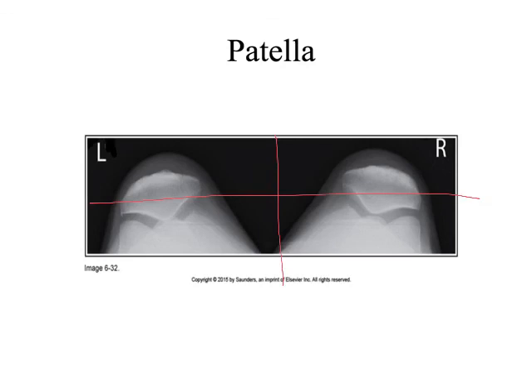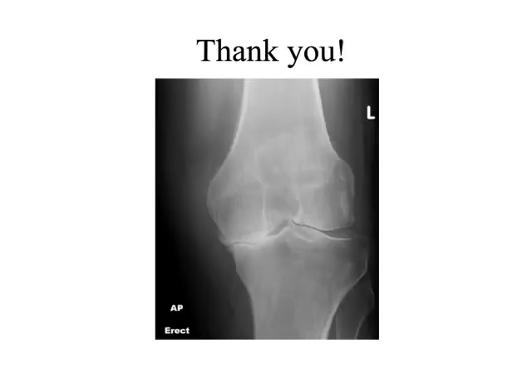Yeah, it looks like this image is not appropriately flipped. Yeah, this thing here. Yeah, there's some kind of artifact. Good eye. All right, that's it.